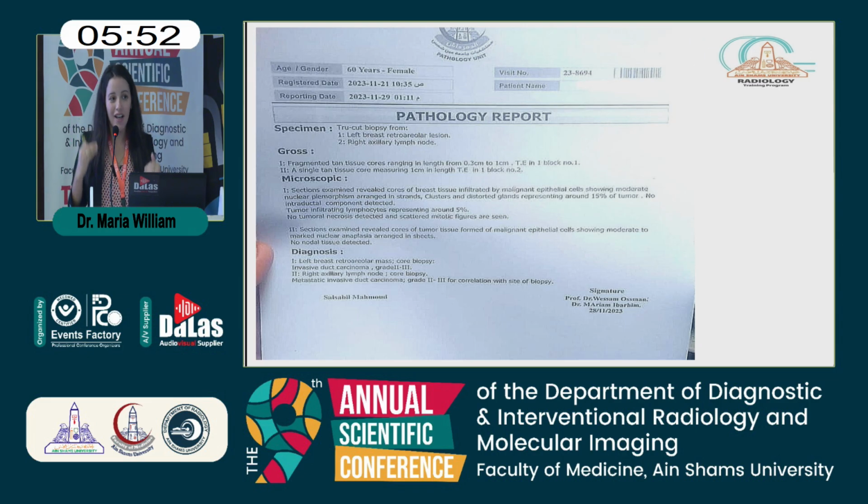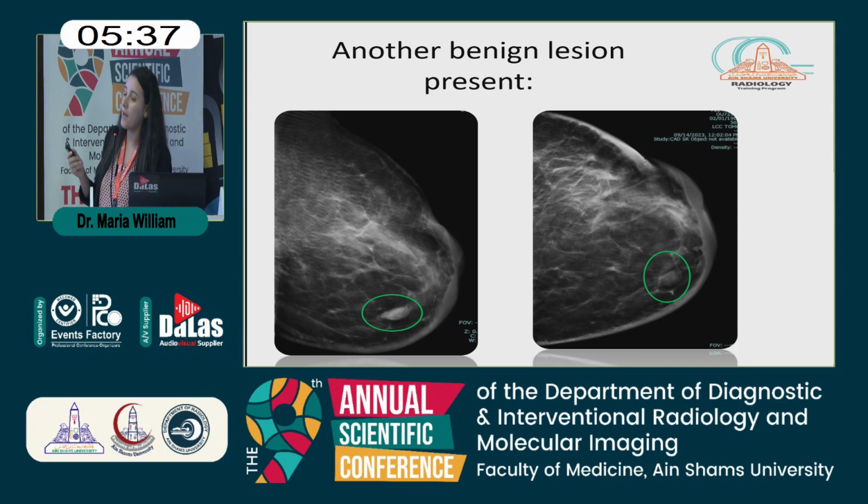And unfortunately, the pathology report and biopsy revealed invasive ductal carcinoma and metastatic lymph nodes. This patient also has a benign lesion. We will present it quickly to see the controversy between benign and malignant.